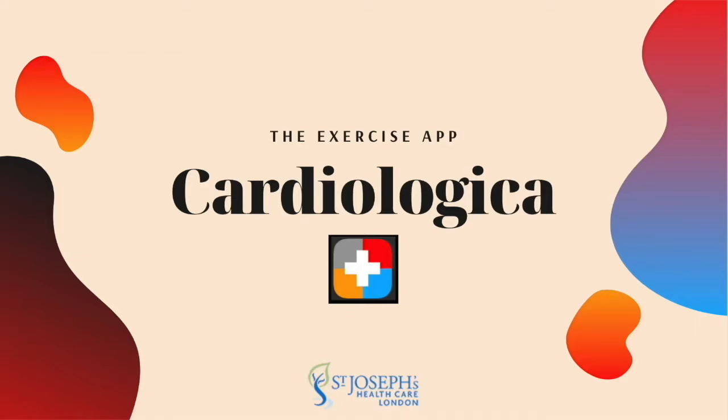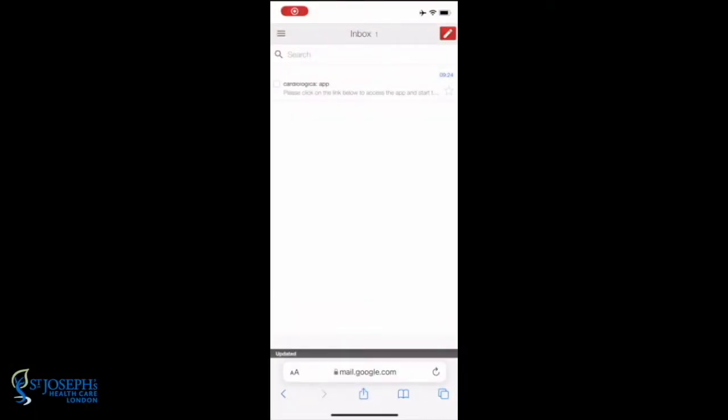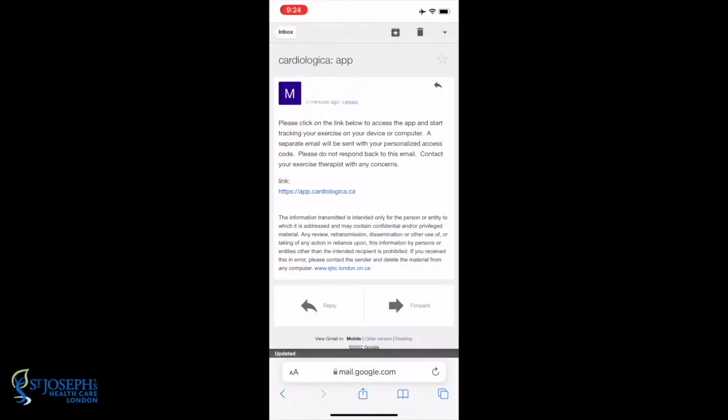This video is designed to provide you with a step-by-step instruction for how to set up your web-based exercise app. Your rehab trainer will have sent you an email with a link to set up the app. Please open this email on the device that you plan to use the app on. Once you have opened that email, please click on the link that is provided.